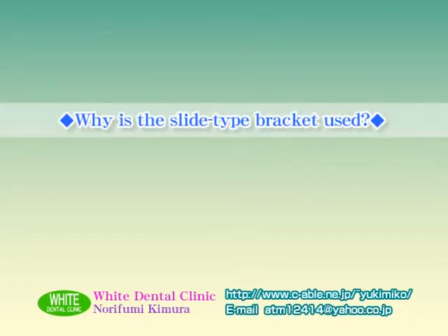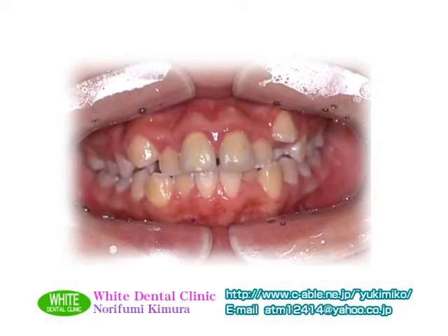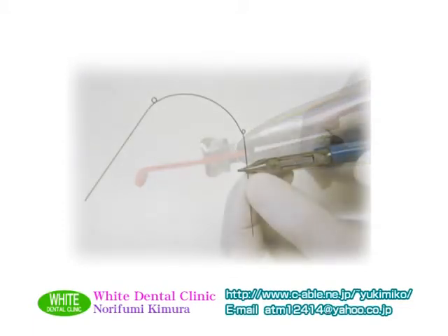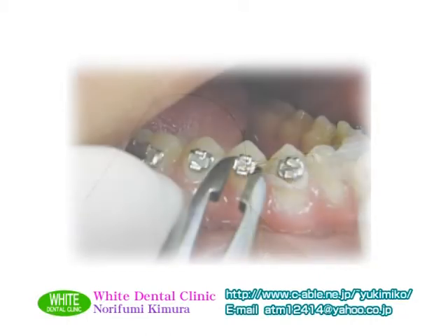Why is the slide type bracket used? Many orthodontists have experienced improper occlusion of the premolar in spite of placing a bracket on the patient's premolar surface using a jig or a gauge. In such cases, frequent reset of the bracket and wire was too annoying.